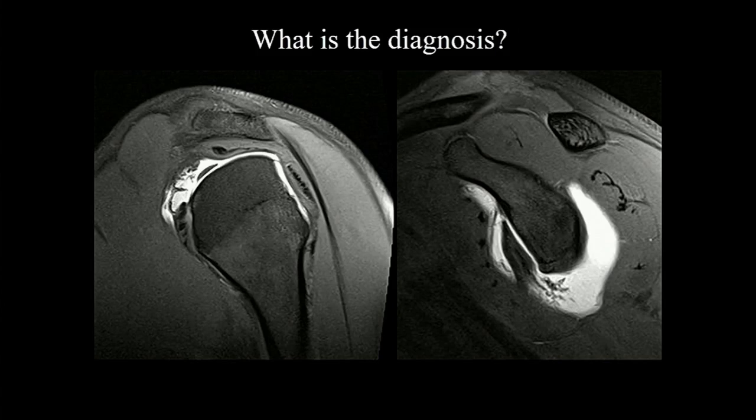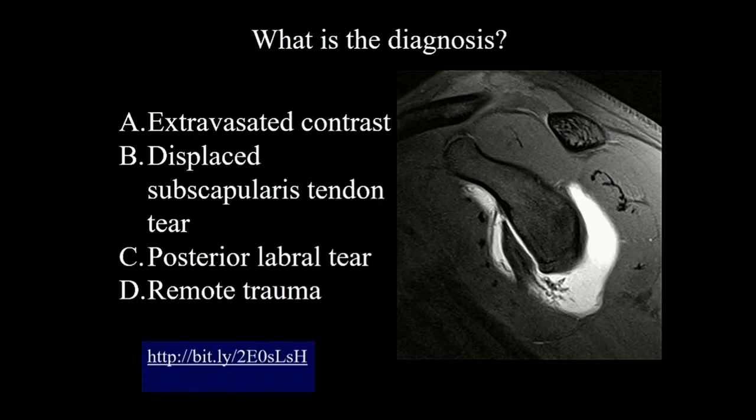Okay, next case. So I'm going to show you two sagittal images on an MR arthrogram and need you to tell me what is the diagnosis. Okay, is this extravasated contrast? Is there a displaced subscapularis tendon tear, posterior labral tear, or has there been remote trauma?